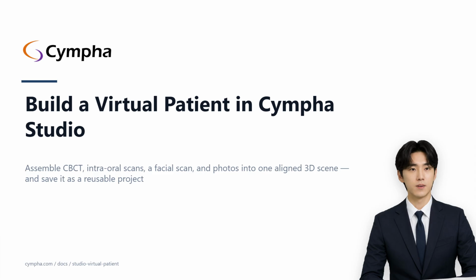This lecture is for orthodontists, oral surgeons, prosthodontists, and lab designers who need all of that data to agree with itself. By the end, you'll know how to load each modality into Studio, how to align each one to the others with a register command, what a successful registration actually looks like, and how to save the assembled scene as a project you can reopen later.